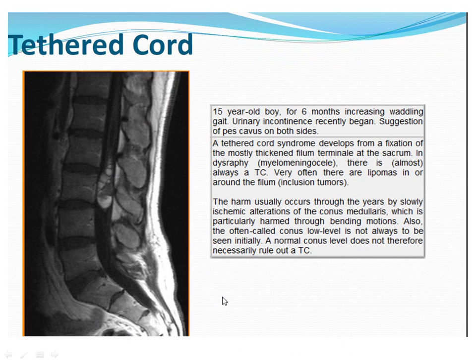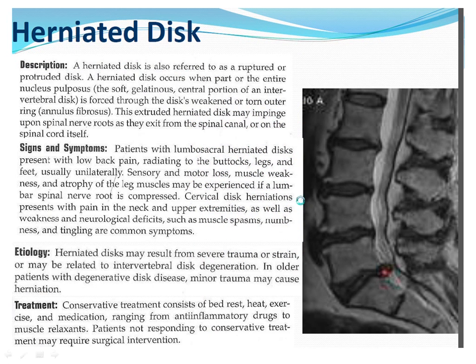This is just another image of a tethered cord, and this one is associated with a fibro-fatty filum. It's a partially fibrous, partially fatty structure there at the end of the conus. So you usually wouldn't see something quite this dramatic, but it's something to look for.